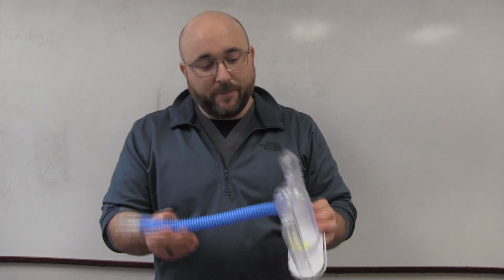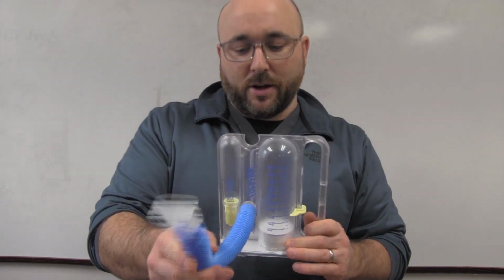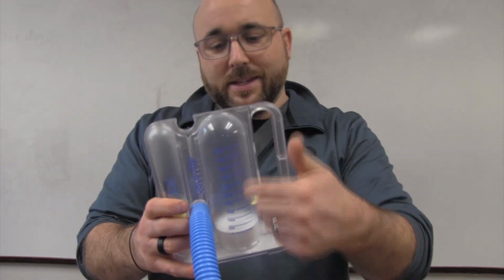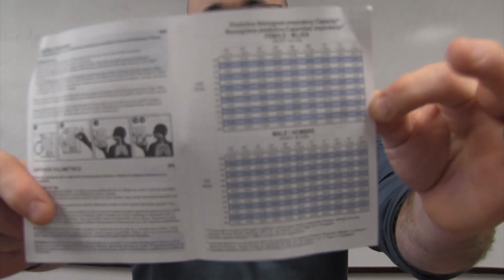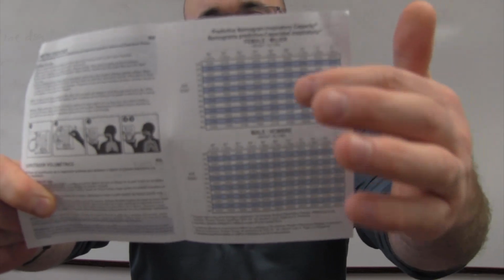The next device we're going to go to is going to reverse it, but this is actually going to prevent it. So what do you need to know about it? Well, it's got the piece for the patient on here. You have this area here, which is semi-important. And then this is the most important, the volume that we're looking for. How do I know what the volume is? Well, you really have to keep that piece of paper that comes with it, and it's going to tell you what their predicted volume is for being female or male and their height and age.